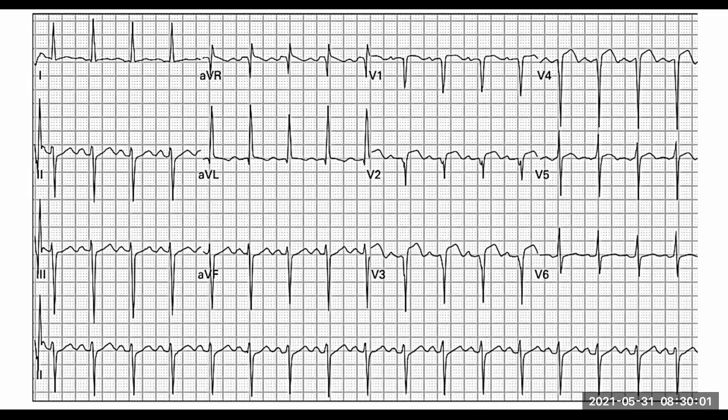Now let's look at each zone. Where would you guys like to concentrate? Where would you like to start? Do you want to start with the abnormalities or just follow our old system? What would you like to do? Let's run for the abnormalities. The first two that we look at, V1 and V2, these are our septum. So what do we notice on our septum?